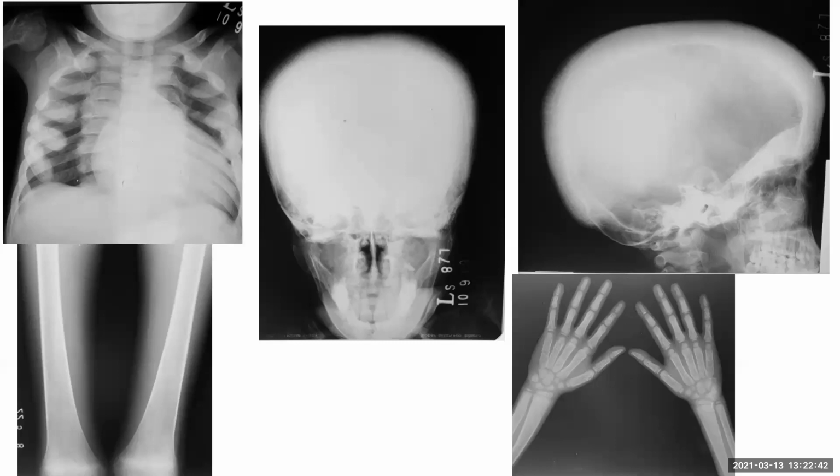In the chest radiograph of another patient, I can see cardiomegaly, increased bone density, and some expansion of the anterior and posterior ends of the ribs, and the humeral head is also looking coarse. So these are all features of a chronic hemolytic anemia with extramedullary hematopoiesis causing bone changes and cardiomegaly in a patient with tiredness.